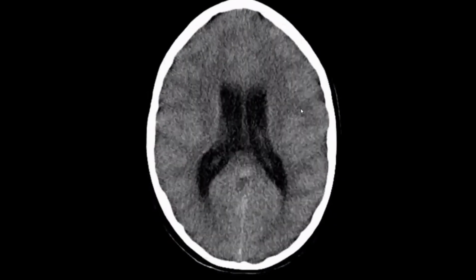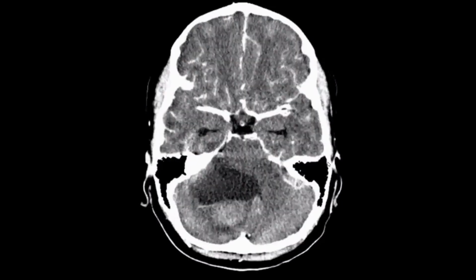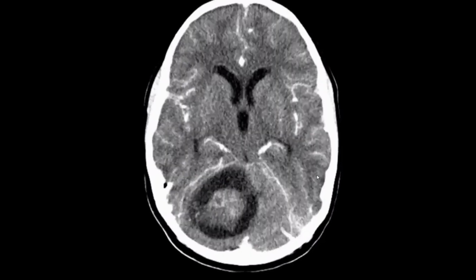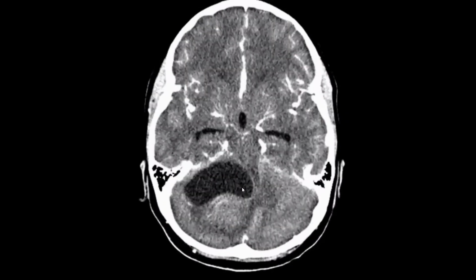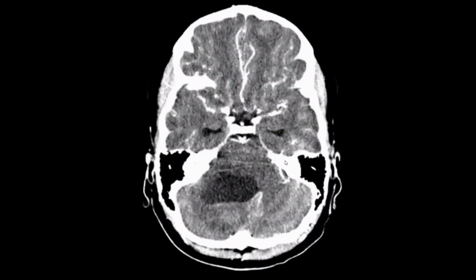And we have secondary hydrocephalic changes, as you said, and we did CT with contrast. And I think the solid component is enhancing. Okay, so you are suspecting pilocytic astrocytoma. Do you have any more differential?